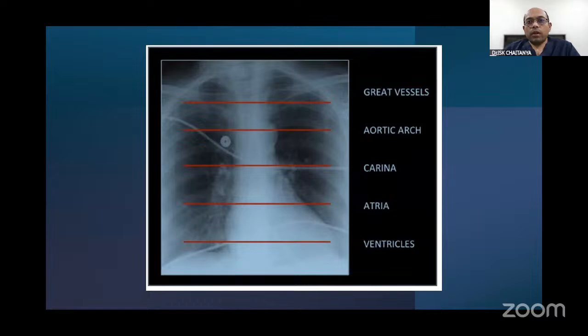So before I go through, this is a chest X-ray where, as I discussed, we can see bones, the lung parenchyma, and the mediastinal structures, especially the upper mediastinum formed by the aortic arch, and the lower mediastinum, with the left border formed by the ventricles and the right border formed by the right atrium. So we were discussing all these borders.